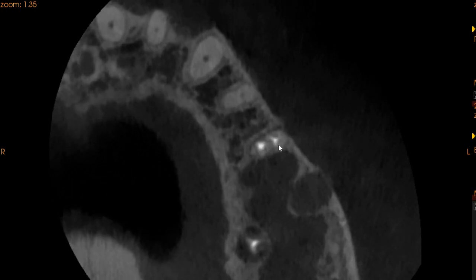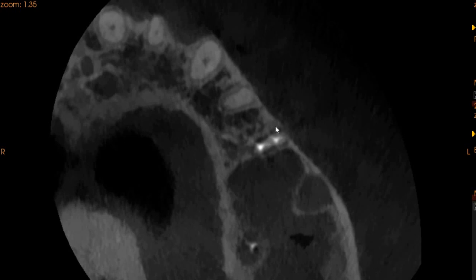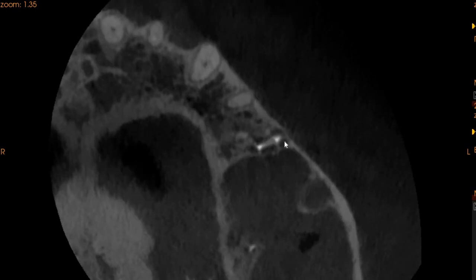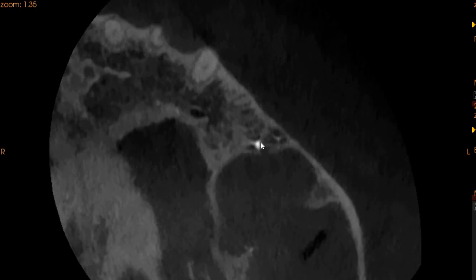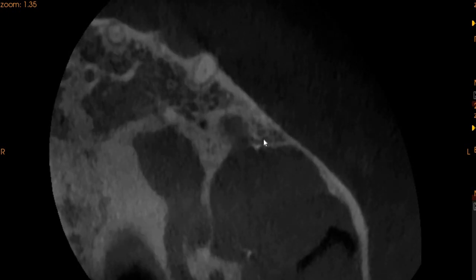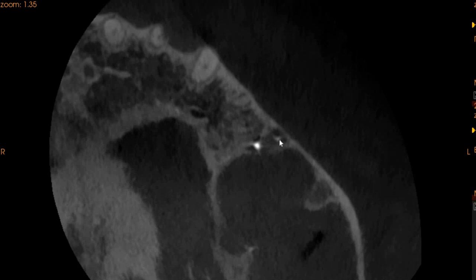or a J-shaped radiolucency, but we do see a periapical radiolucency which starts here as the apex of the tooth has ended, and here it is very visible that the sinus is extremely filled with mucus and the sinus floor has been perforated, and the radio opaque material is present within the sinus as well.